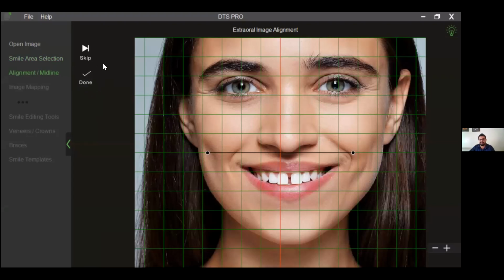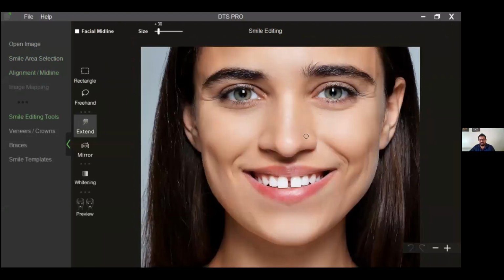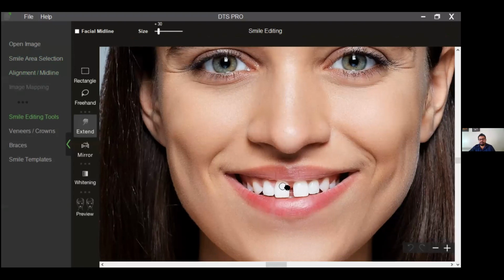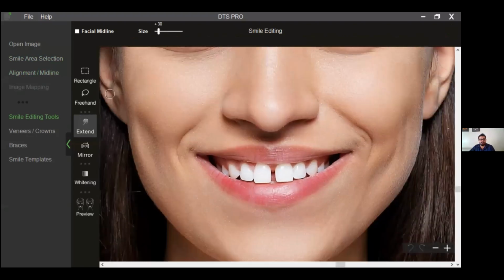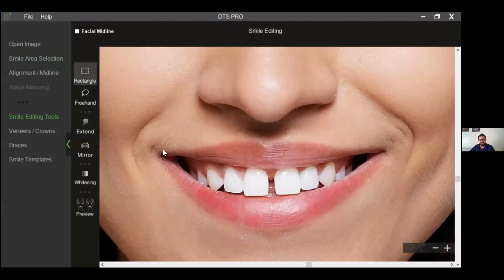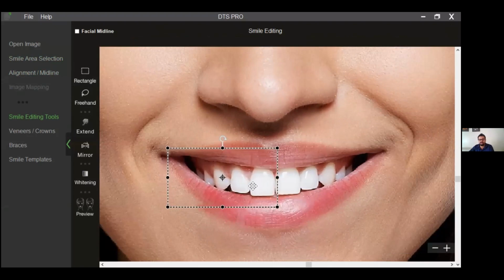and a retracted intraoral image. So that's a normal protocol. Even before the patient has come inside the dental office, we typically follow these guidelines. Now, I use this photograph itself to carry out simulation. So the simulation for orthodontics, I would do somewhat like this, where I would just select that group of teeth and move it as a quadrant.